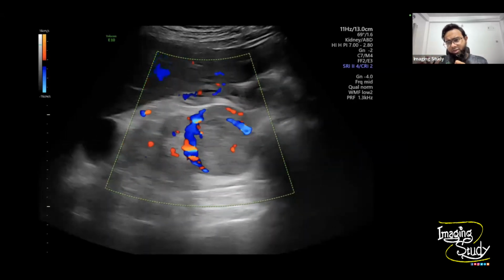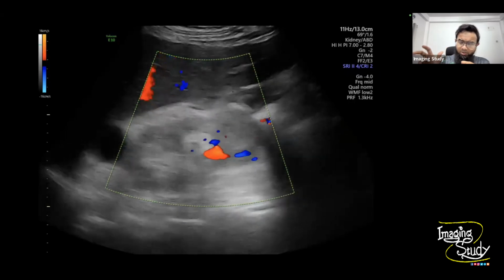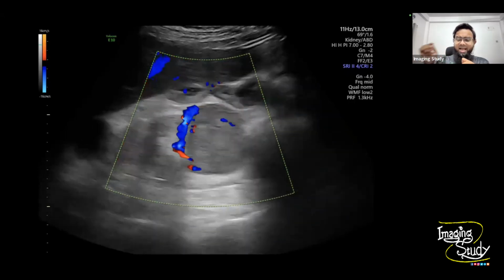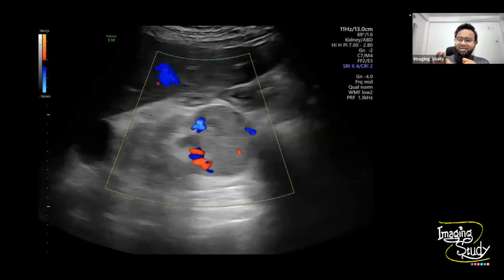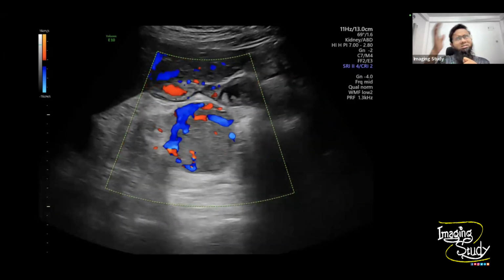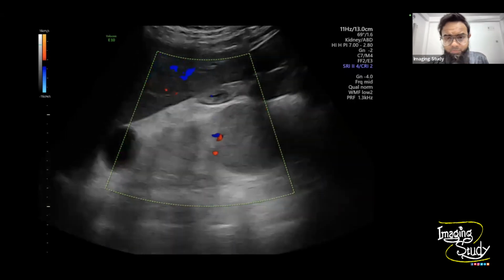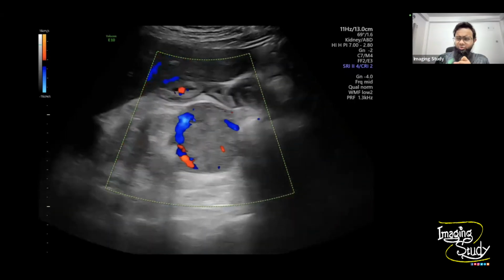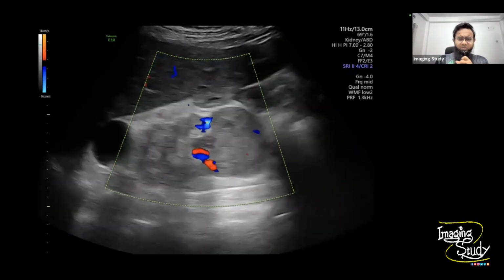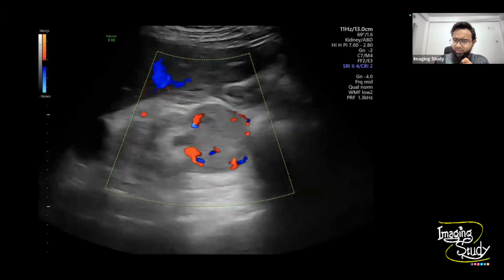In this classification, if there is a large peripheral vessel and penetrating central vessels present, we go for class 4. You can just search the classification. It's not important to write down type 4 vascularity, as the clinician will get confused. Rather, you can just describe it.